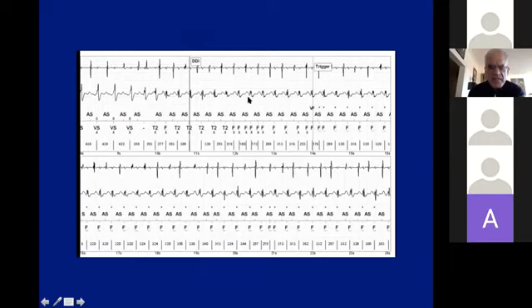It's T-wave oversensing. See, it's seeing the T-waves. If there is one thing that you will bring back from this lecture, always look at the markers. Always look at what the device is thinking. Looking at the markers, this marker corresponds to the T-wave. This marker corresponds to the QRS. So the device is double counting.